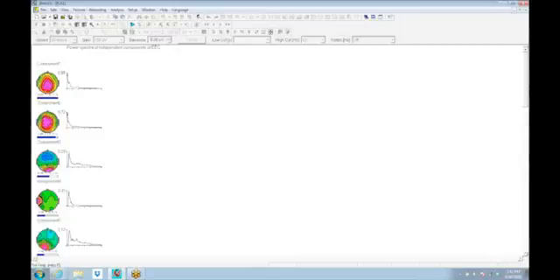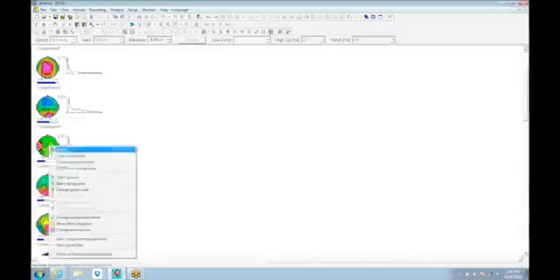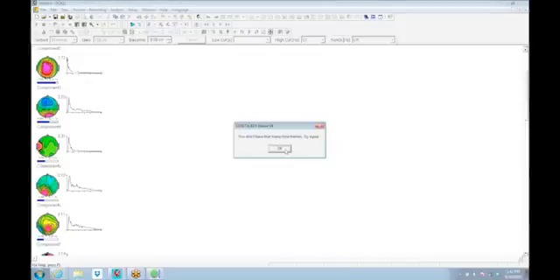I didn't catch a good chunk of that. I'm sorry. Let me do the Loreta for the component.